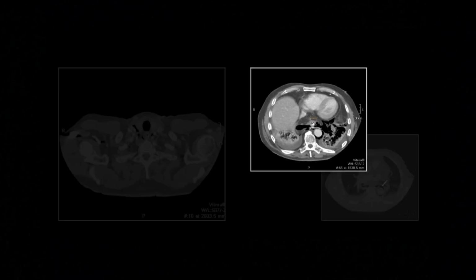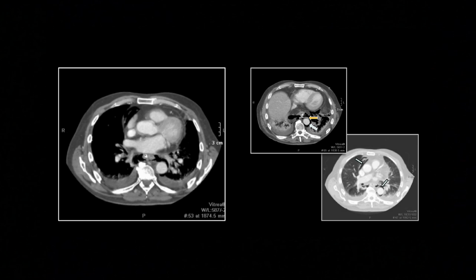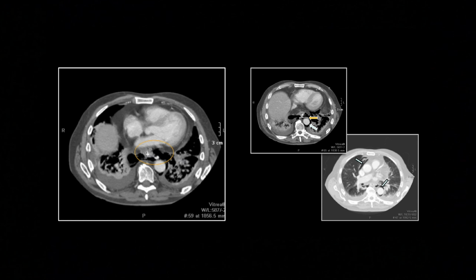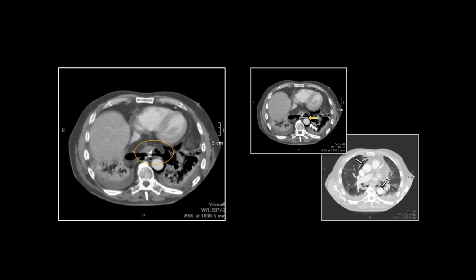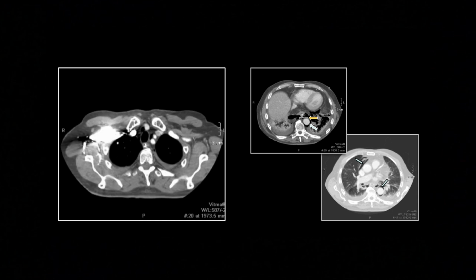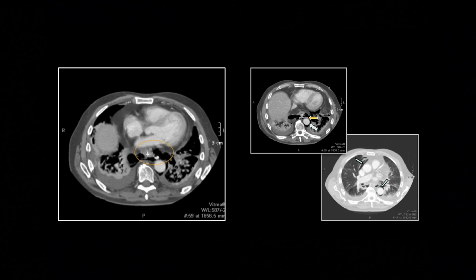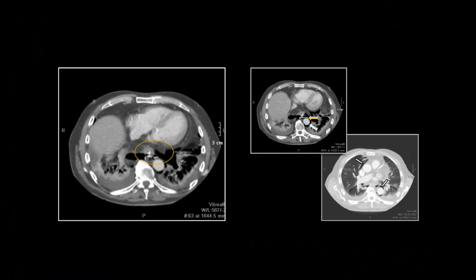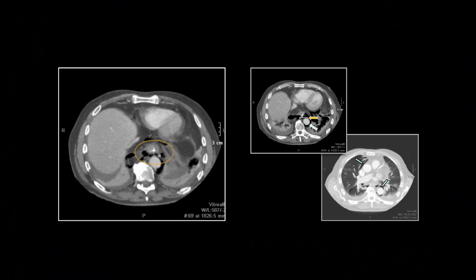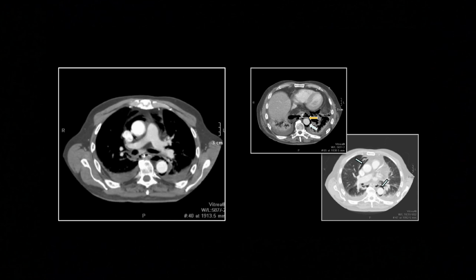This, of course, the esophageal rupture and fairly low down, is pretty typical for Boerhaave syndrome. This is a patient who was retching or having unproductive vomiting, right, and ultimately ruptured the esophagus. And there is some wall thickening, but as you can see, it's just segmental in the lower esophagus. And that contrast, again, is spilling out into the posterior mediastinum. So that is a case of Boerhaave syndrome and esophageal rupture.